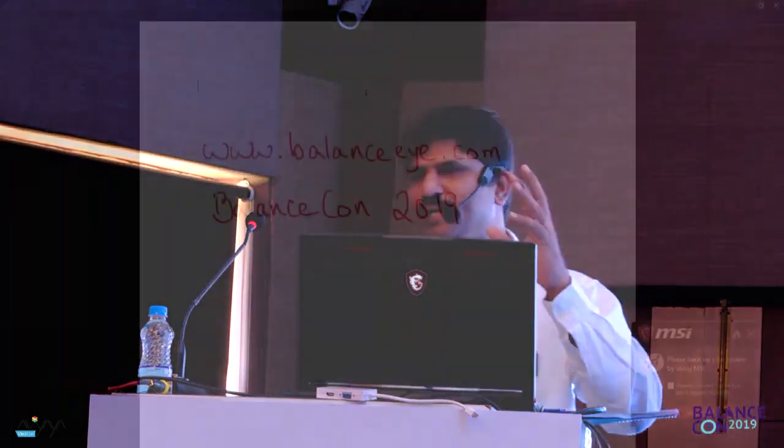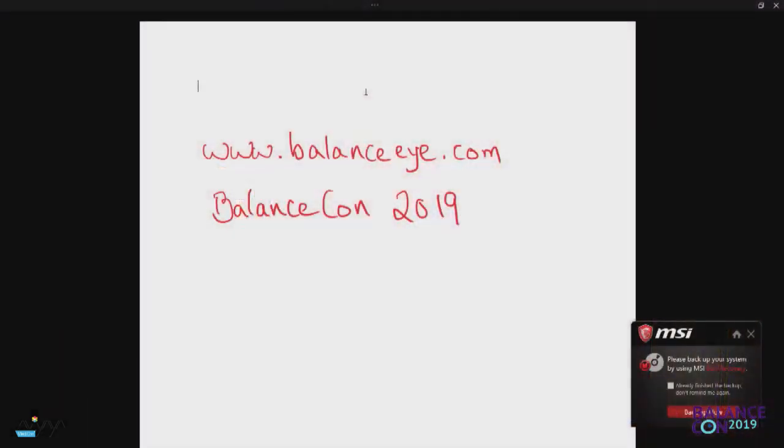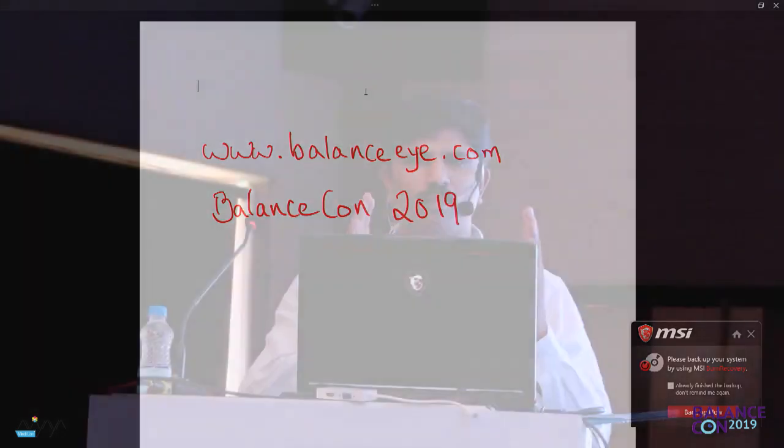So, for each eye, how many traces are there? Two traces for each eye. So there are basically 4 traces. In case there is a target to be followed, for each eye again there will be 2 traces, but only horizontal or vertical.